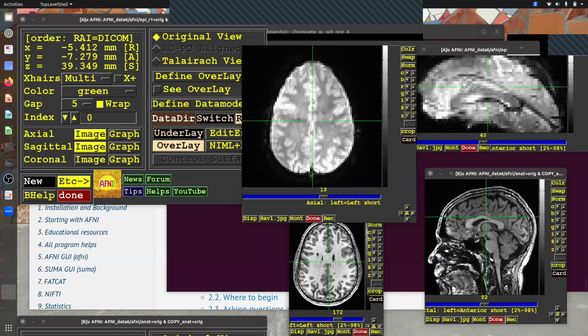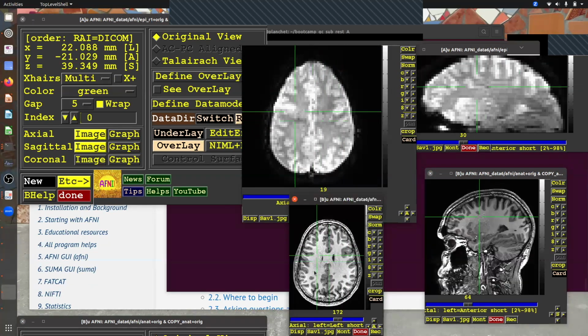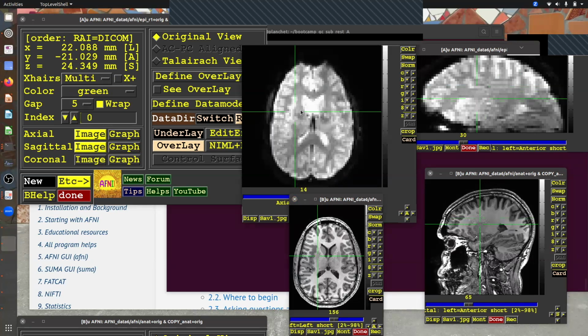One thing to notice is that the different tissue contrasts are a little different here. So here in white matter, it's the brightest part. In this image, it's the darkest. We're not really concerned so much with that, but with the fact that you can see the image quality, right? This is your modern day iPhone, and this is probably the iPhone that I still use, or an older model or something like that. But yeah, just a lot grainier.